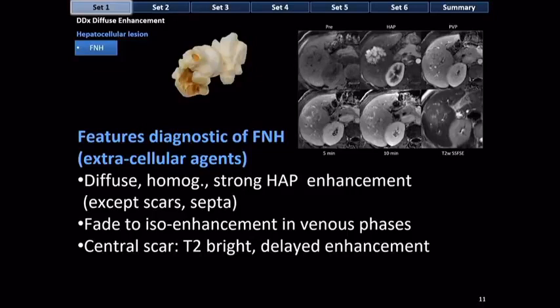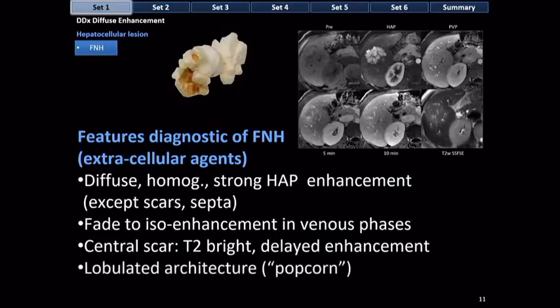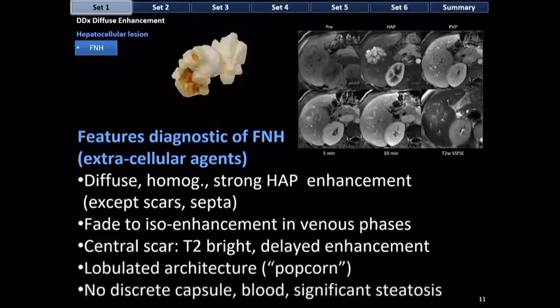And Dr. Clausen, now I know you're probably embarrassed for us radiologists that we rely on signs like the popcorn sign of FNH. I'm sure in pathology you're more sophisticated than this. But anyway, we do what we can. You have a popcorn sign too, but for FNH or for something else? For Hodgkin's disease, okay. So if you're a pathologist and you see popcorn, think Hodgkin's. If you're a radiologist, think FNH, okay.